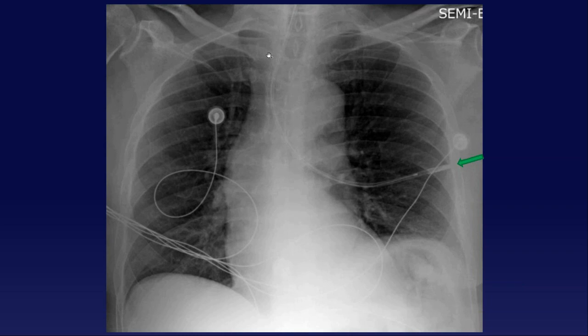I'm sure we've all swallowed fish bones or something like that and it hasn't perforated. Not that I'm encouraging that, right? But the esophagus is pretty robust. It takes a lot to go through. So when you see something like this, it will be through the airway. I've never seen it with the esophagus.